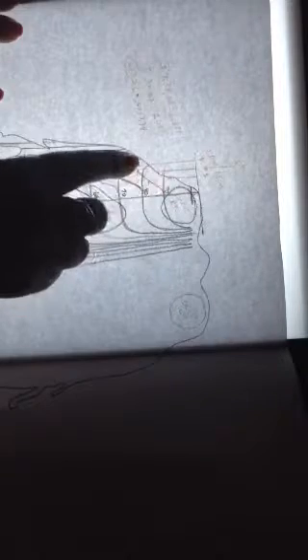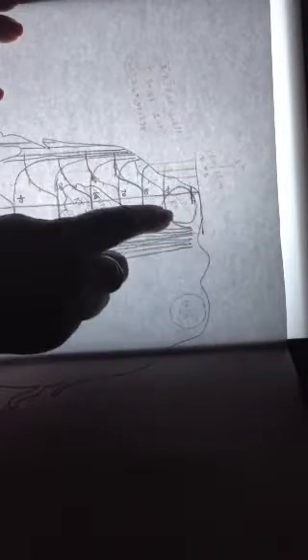Now the reason I'm going downward is because there's no tissue here. So the dose lines over on the side where there's no tissue are going to be shifted downward because absorption wouldn't happen until later. If I had extra tissue over here, dose lines would actually shift upward. Okay, so I did the same for each one of the segments. Put the grid lines.